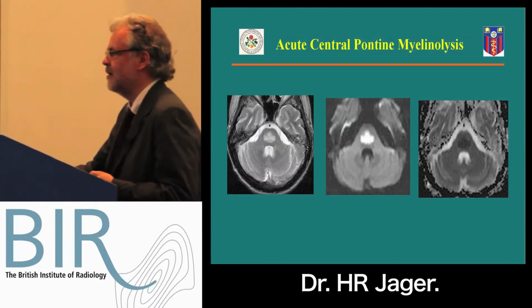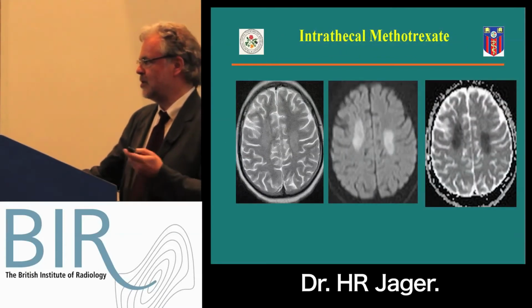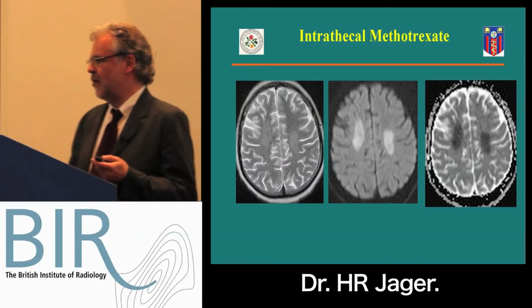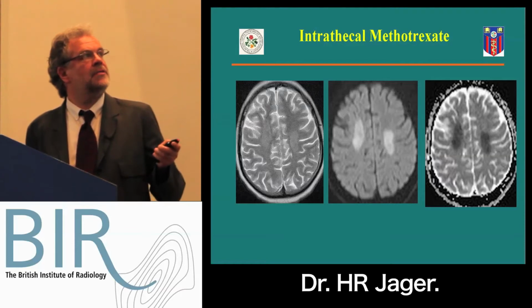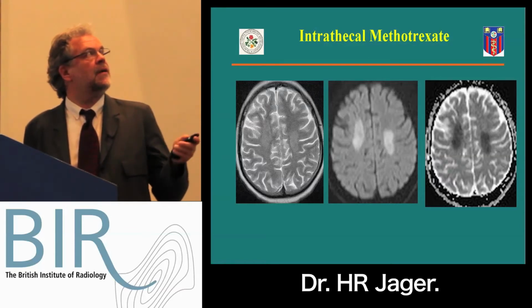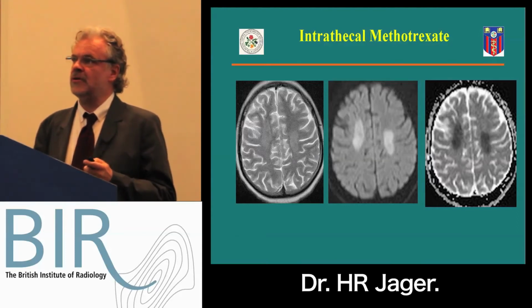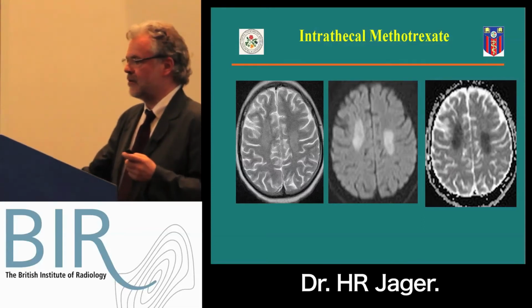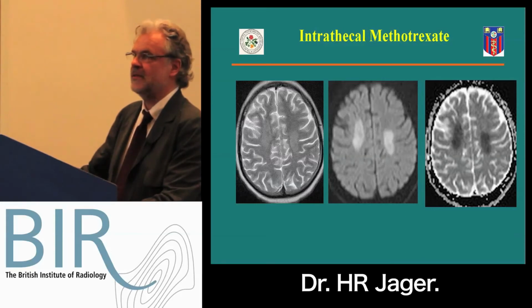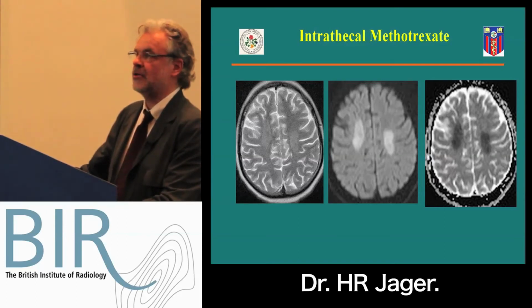Something that Dom is very familiar with is intrathecal methotrexate for leukemia treatment. You know, in children we see that often, and you see it also very often if they present with a motor deficit, and sometimes you can't even see anything on the T2. You see this, it's a cytotoxic effect, a typical methotrexate-induced restriction of diffusion bilaterally in both centra semiovale. So this is not a cardiovascular stroke. This is in multiple territories. This is a typical thing if you work in a cancer center, methotrexate-induced cytotoxicity and cellular swelling, and that's partially reversible.